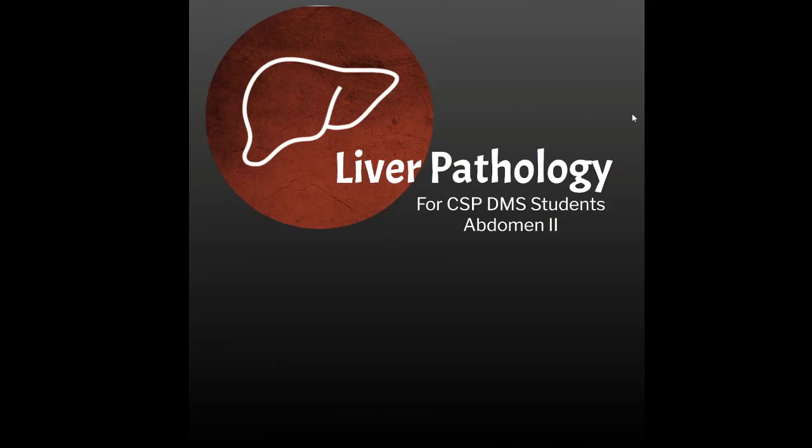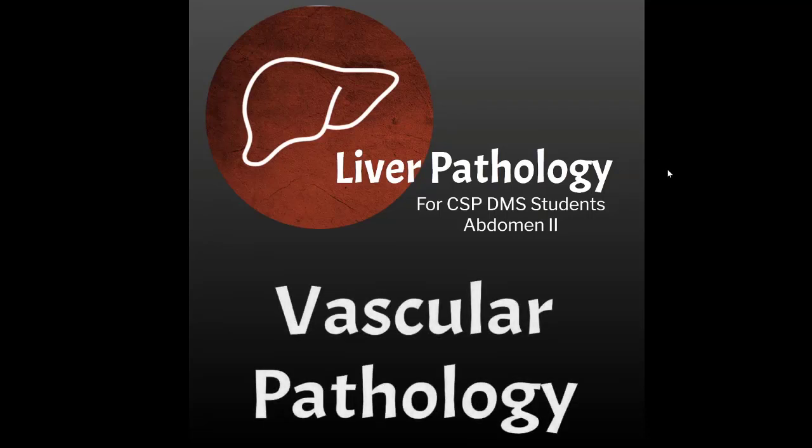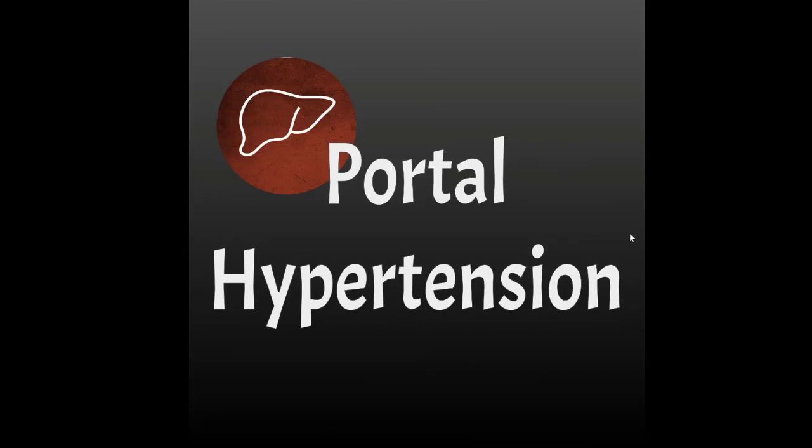Hello and welcome back to another pathology lesson where we take a look at abdominal pathologies and what they appear like on ultrasound. Today's lesson is the second part in a 5-part series of liver pathology focusing on vascular pathology. We're going to begin this lesson then with portal hypertension.